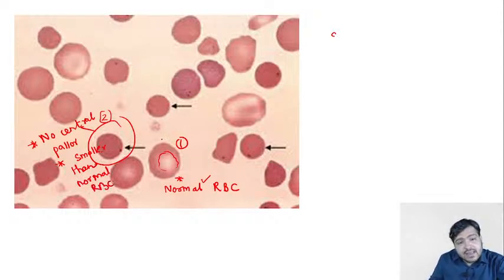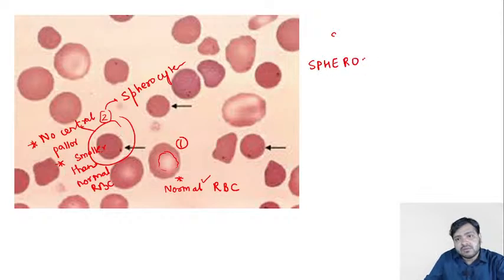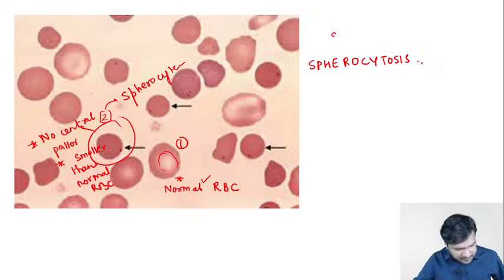And remember that this particular structure that I have shown in the second is the spherocyte. This image is showing spherocytosis.